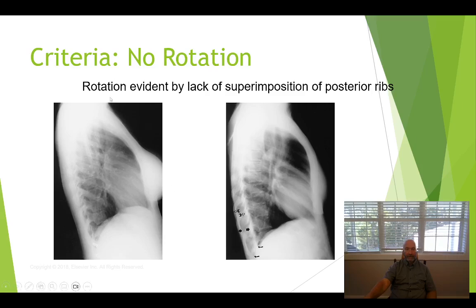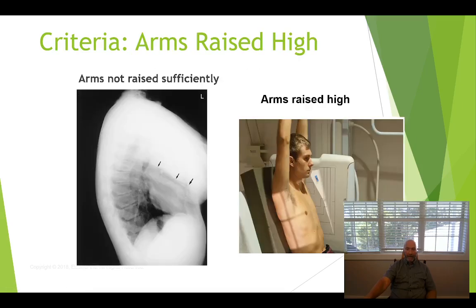Lateral chest X-ray, this is very good positioning, and sometimes it's difficult to get a lateral chest without any kind of rotation. So a couple of things on this particular image. One is make sure that you get your arms up. You can't see the apex of the lungs, really the anterior portion of the lung at all, because the arms aren't up and out of the way.